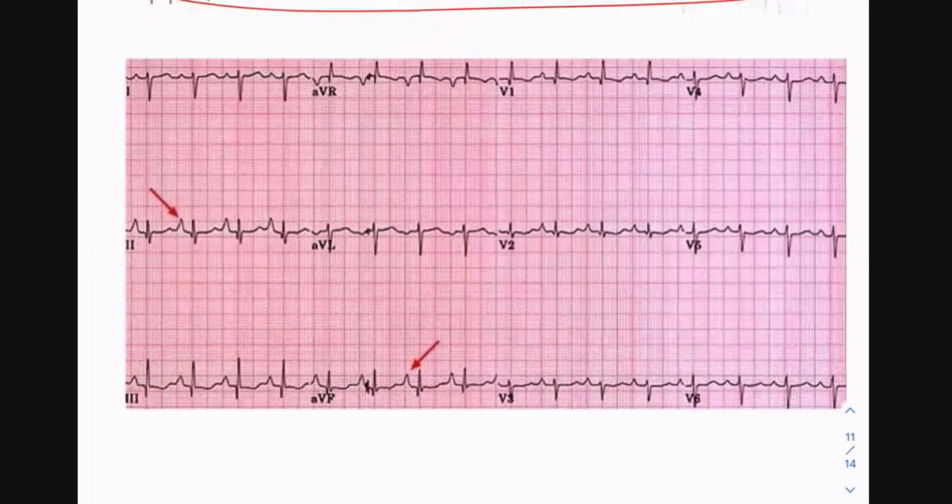Next, no sinus rhythm strip, but that's okay. I'm going to start with lead 2, and I see P, QRST, P, QRST. However, they point out the P waves, so that's nice. They're kind of telling us what's wrong. What's wrong with these P waves? What's wrong with them is they're tall. We have tall P waves, or peaked P waves this time.